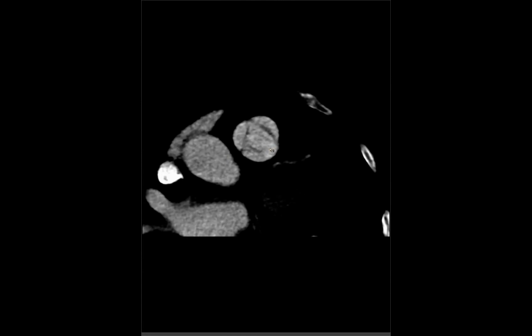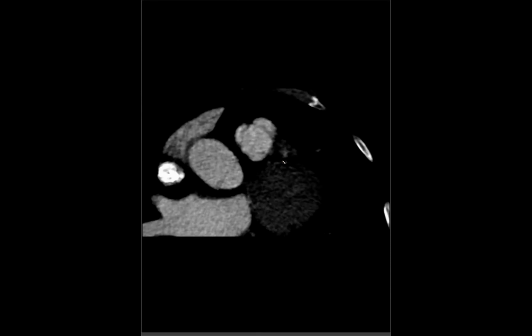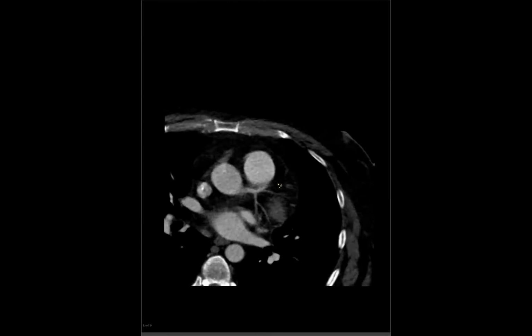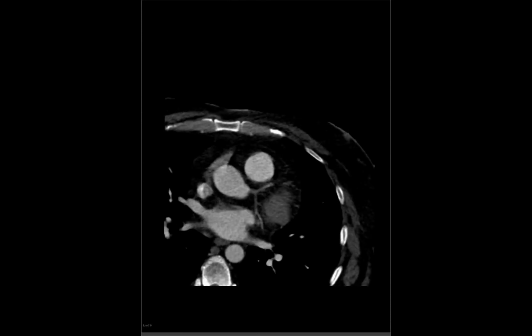So, Brian, I showed one of these at UCSF. This isn't a patient that happened to go to Davis afterwards, is it? Because it's the exact same story. It was incidentally discovered and they had an enlarged pulmonary artery. Oh, I remember my colleague Kim had found papers talking about the association between pulmonary artery aneurysm and quadricuspid valves.